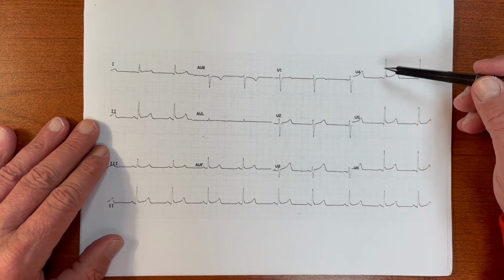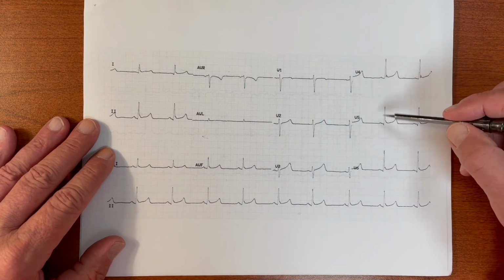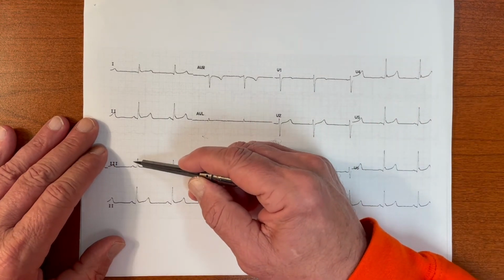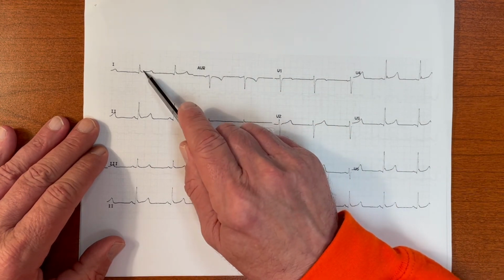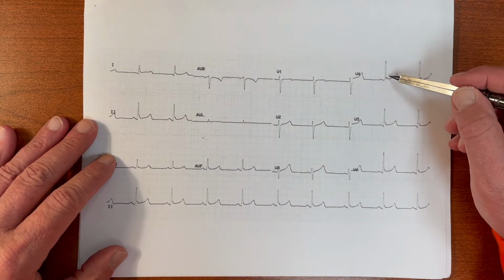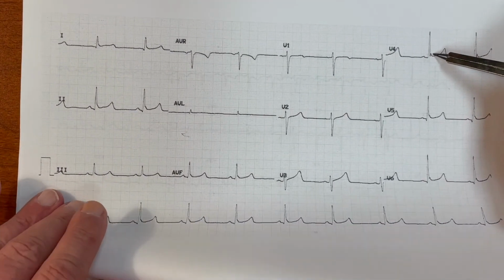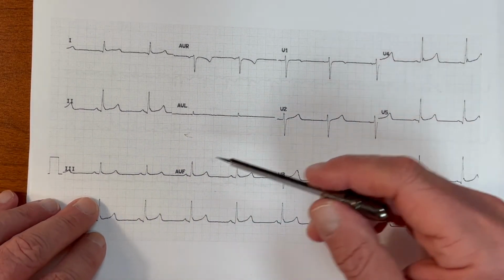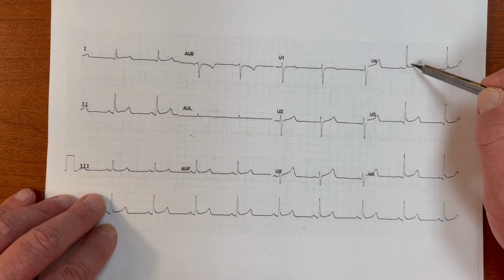All right, when we look at this QRS, what do we notice? My eyes jump here to V4. It goes up, it comes down, and there's this notch. See the same thing in V5, same thing in V6. Same thing right there in 3, same thing there in aVF, same thing there in limb lead 2, a suggestion of the same in 1. All right. So that notch gives you a clue to what the diagnosis is, which would be benign early repolarization. Okay. So again, the morphology is concave, diffuse, mild, and that notch.